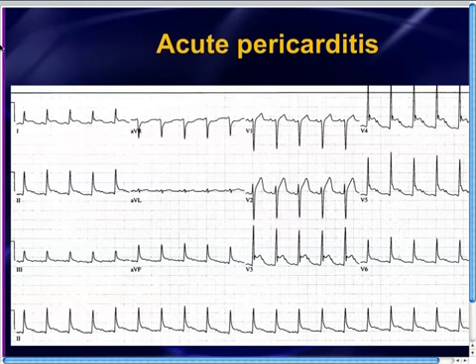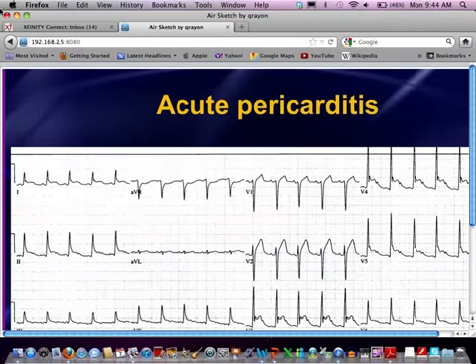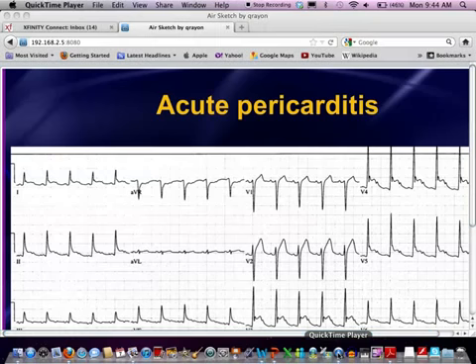And so this ugly, ugly looking EKG, it turns out, was nothing more than acute pericarditis rather than a large MI. Clinically, it was not an easy call because this patient looked really, really sick. He looked extremely uncomfortable. And so it could very well have been a massive MI in this particular case. It was not clear, but I thought it was an interesting case because it just kind of walked through the differential for ST elevation and also the decision making that you need to use when you face these conditions where the diagnosis is not clear using some of those simple rules.